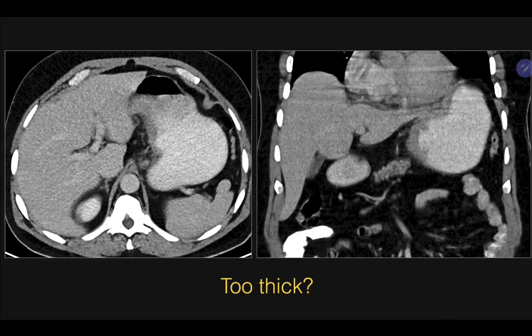Let's wrap up adenocarcinoma with two practice cases. In this case, there is a relatively subtle amount of wall thickening along the lesser curvature. Remember that adenocarcinoma will usually leave clues. So what do you think?